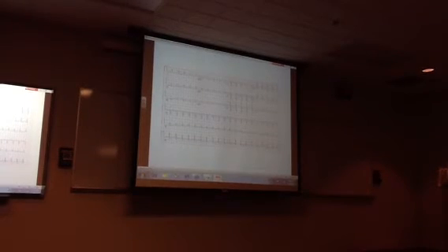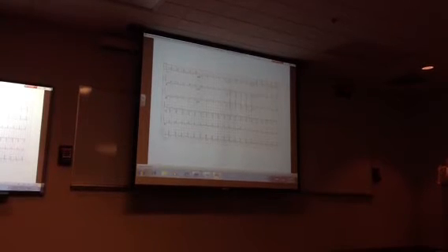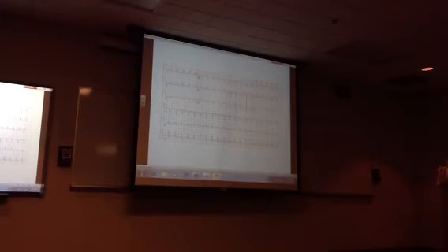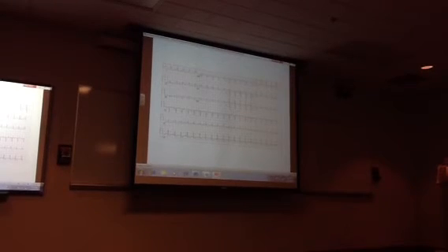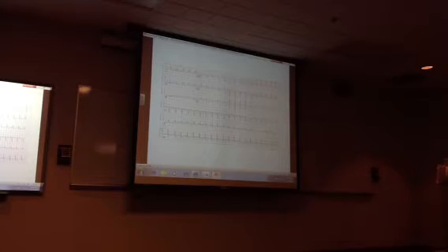All right. What about is it normal sinus rhythm? It is a sinus rhythm. What do we look for? What are the criteria for normal sinus mechanism? P-wave before every QRS, normal QRS in terms of interval, QRS after every P, and RR intervals are identical. So Jeremy says this is normal sinus mechanism, right? Cool. What about the axis?